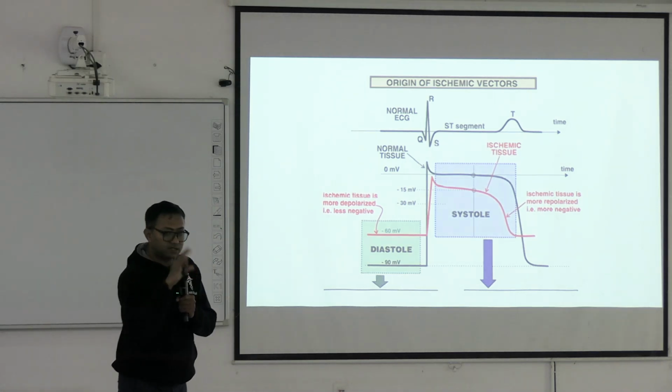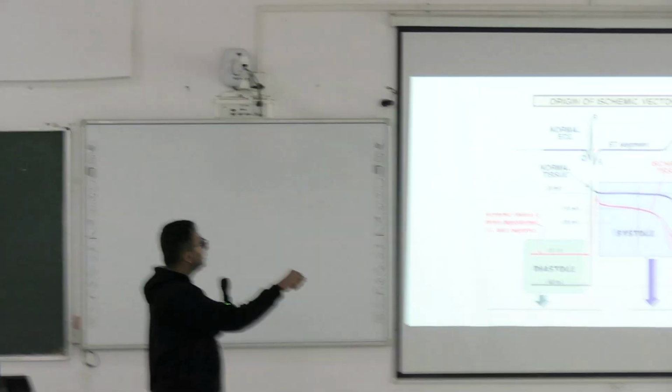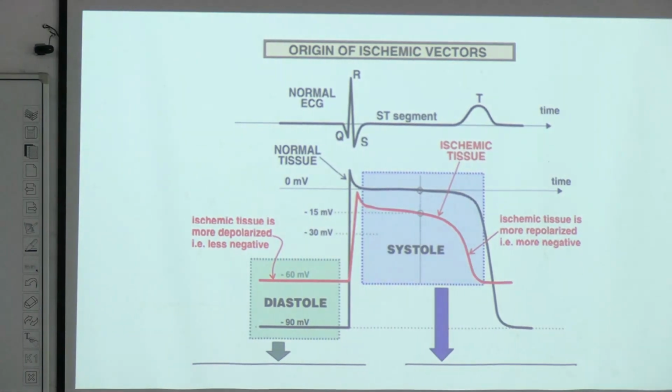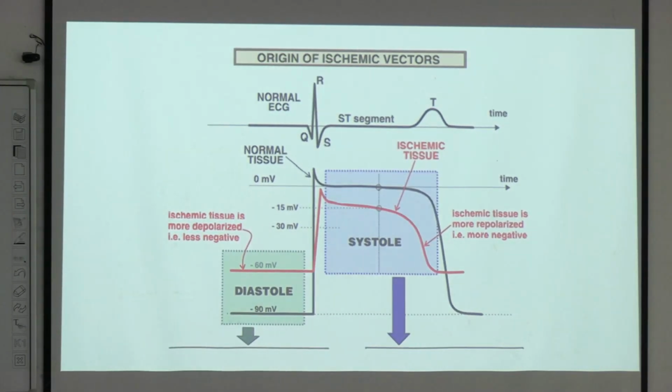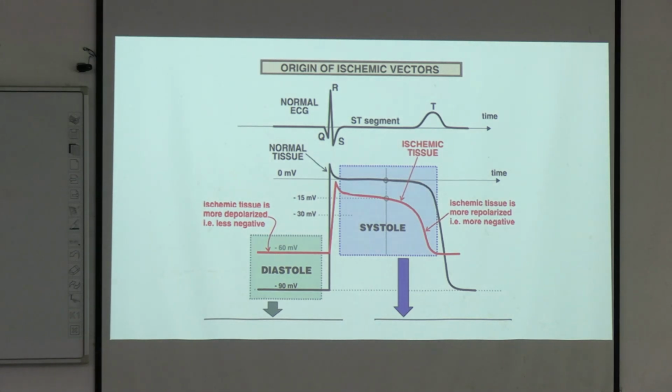So we are only concerned with the ventricle. What is happening in the ventricle? During this QRST complex, this action potential is actually happening. This is the same time frame. Both are superimposed on the same time frame: the ventricular fast response action potential and the corresponding ECG. So this is the beginning of systole, and it starts with QRST, right?